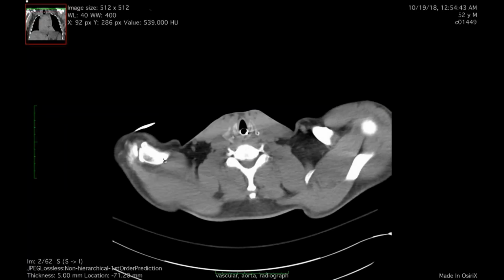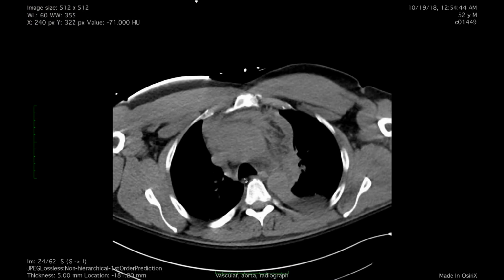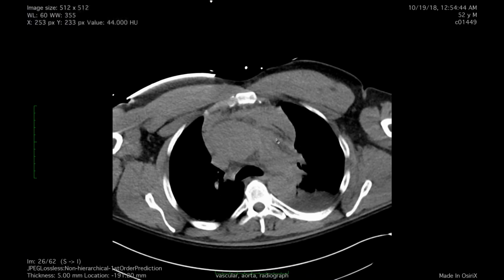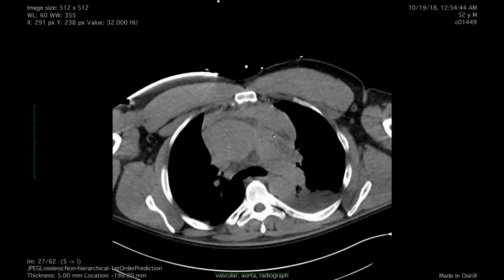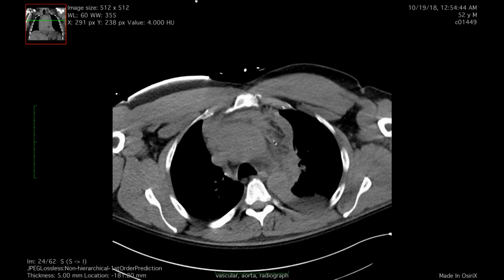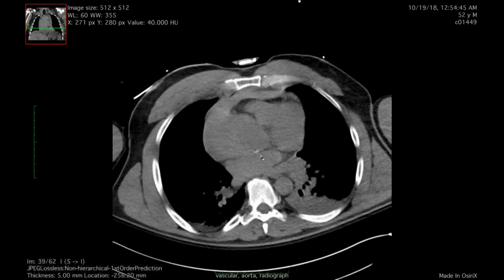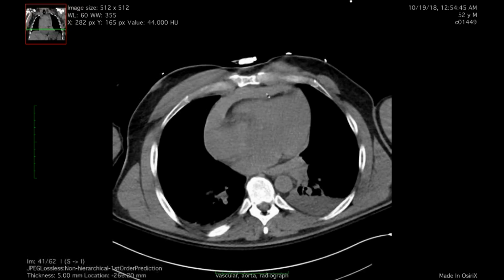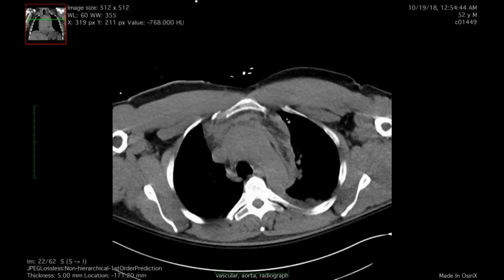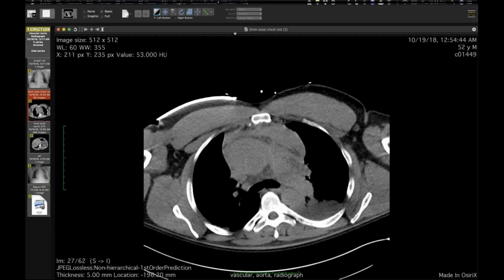But you'll see here on the subsequent CT that was done, he's still intubated. And, kind of along the theme with Howard's case, but a different case in this instance, we see the large mediastinal hematoma, and even on the non-con, you can see the intimal flap being displaced. So he had both hemopericardium, as you see here, and mediastinal hematoma from a ruptured, no surprise, type A dissection.